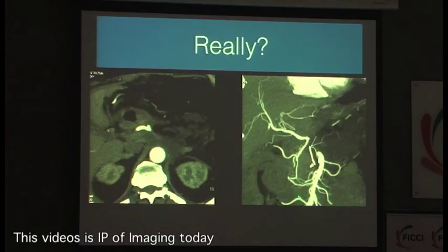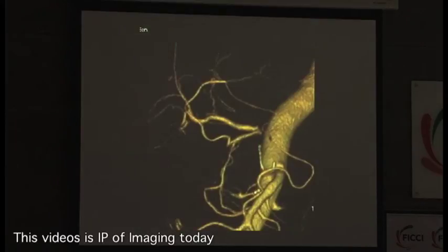But the patient is doing well. Why? Because the GDA decided to help out. So just an interesting case where you removed the entire celiac axis, but you can still see the hepatic arteries filling through the GDA, right? Oh, okay, there, that's the VR image for this patient showing you that he actually has no common hepatic artery and no celiac trunk, and those are the surgical staples. So that was an interesting case we had.